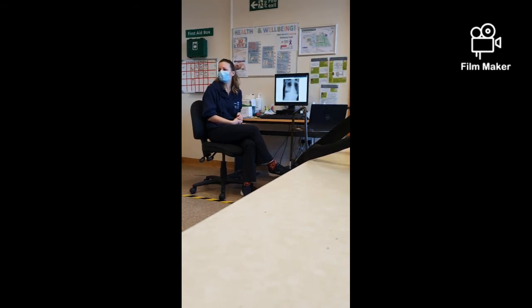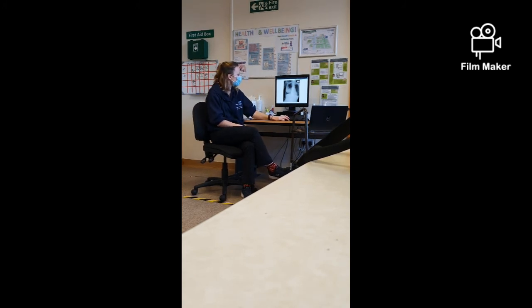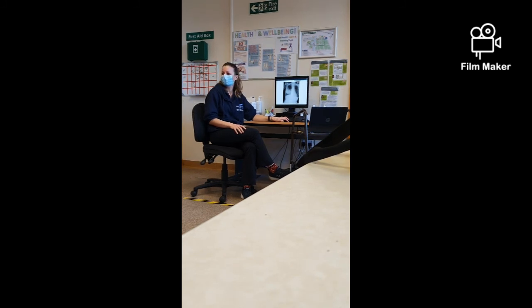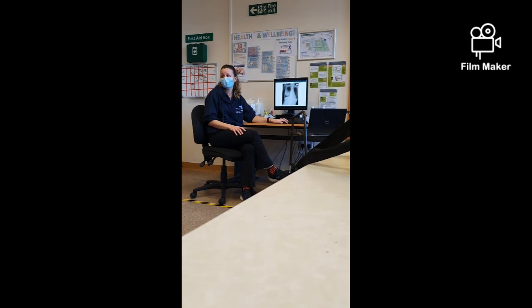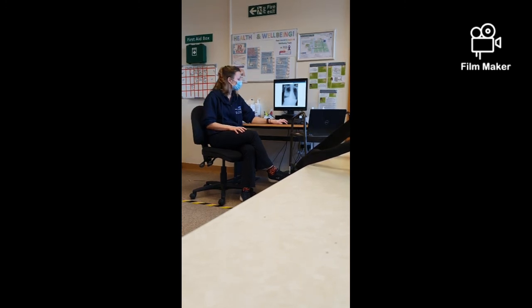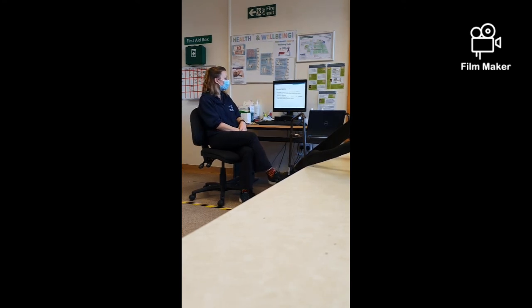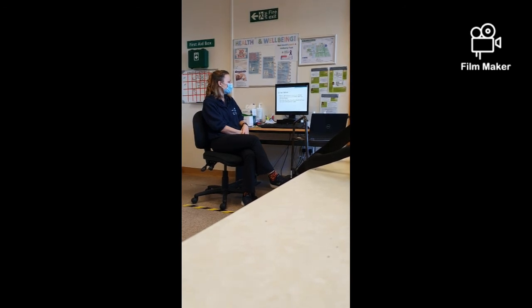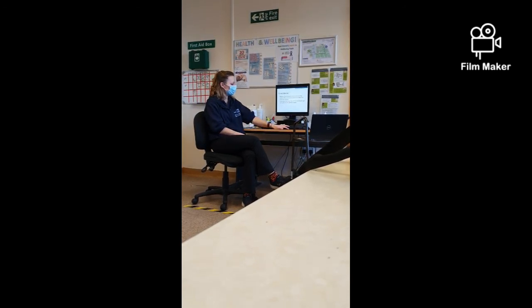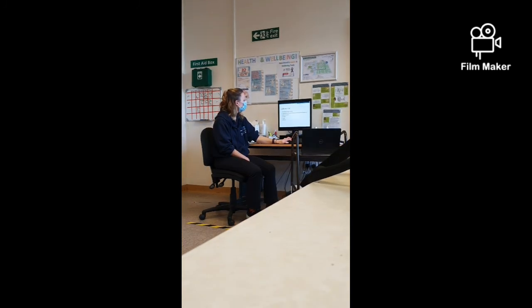What do you do in the respiratory assessment? Yeah, auscultate. Thank you, Jade. So if you're auscultating, what would you hear? Potentially crackles or reduced breath sounds. Yeah. Okay. So consolidation: you've got reduced translucency over the area of the lung without the associated mediastinal shift that occurs in collapse. And you can get the blunting and the loss of angles, but that was a mid-zone one. Okay.